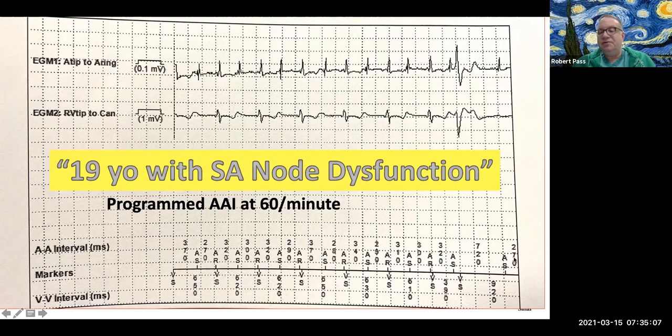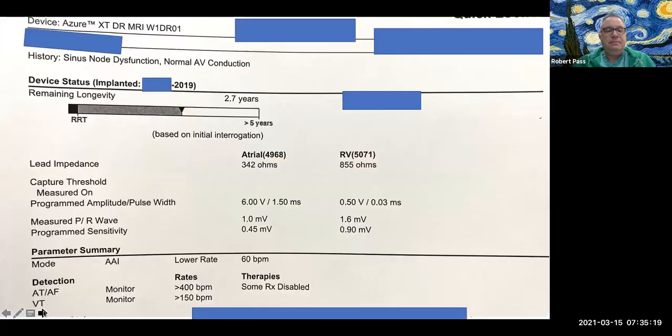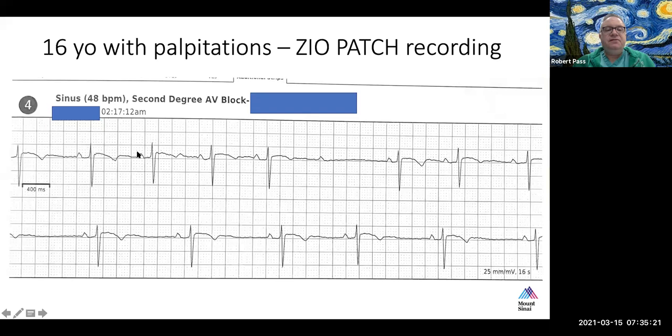It does look, though, from this 270 here, like probably the next beat is fast. So this is probably some kind of sinus tachycardia. So, interesting tracing. And this will be our final one today.